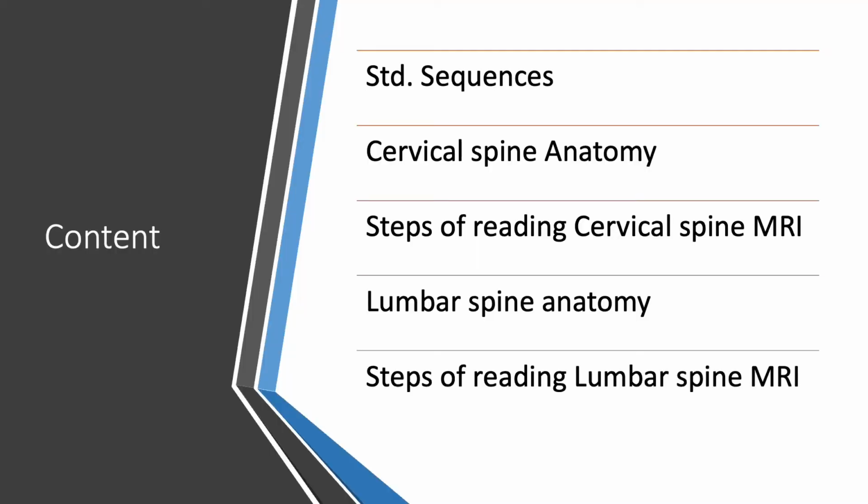In this talk, I will be talking about standard sequences in an MRI. We'll be going through cervical spine anatomy, steps of reading a cervical spine MRI. Then we will be talking about lumbar spine anatomy. Then go on to steps of reading a lumbar spine MRI.